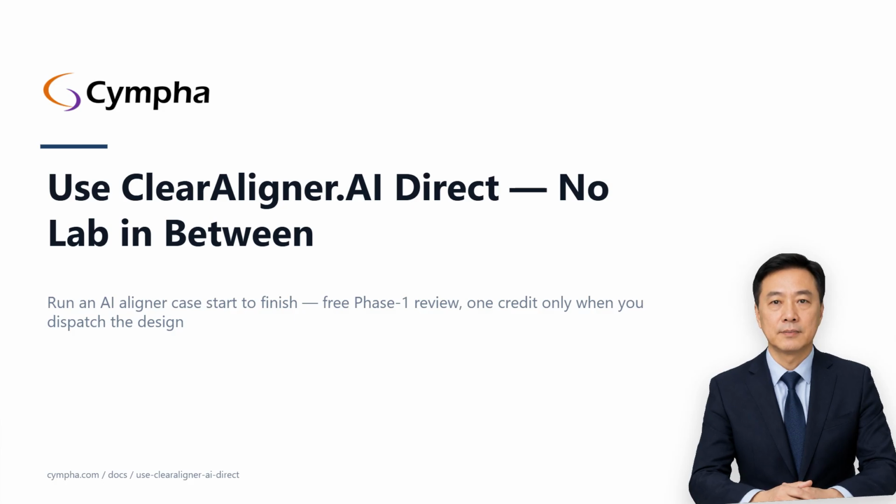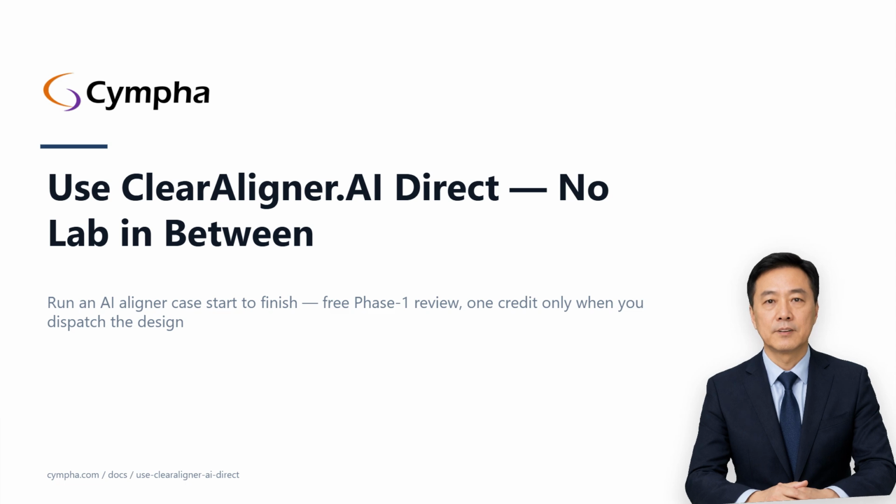By the end, you'll know how the direct flow differs from the regular new case form, how credits work. Phase 1 planning is free, and you pay 1 credit only when you self-approve and dispatch the appliance design, and how to take a case from scan to finished aligner files. Budget about 15 minutes for your first case, 5 to submit, 5 for the plan to come back, and 5 to review and approve. Follow along on screen, or listen now and read the written guide later.